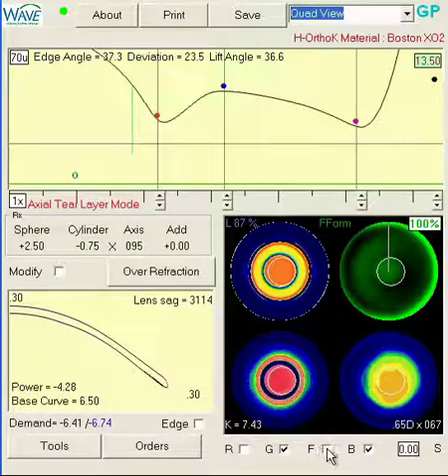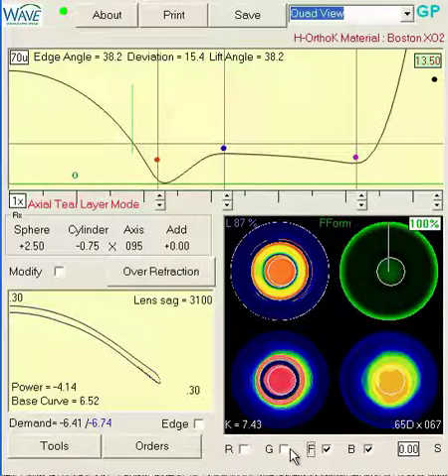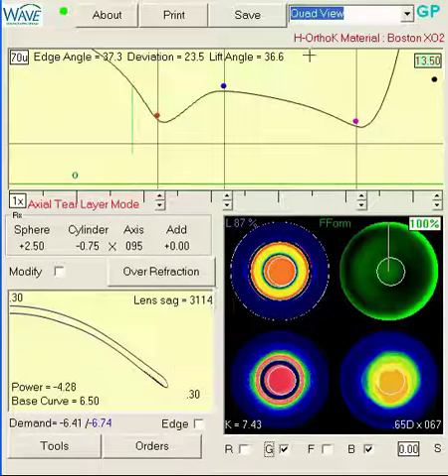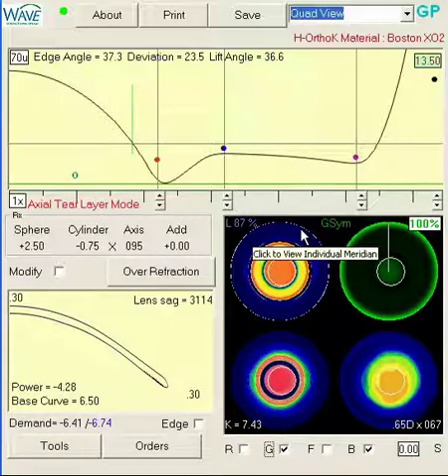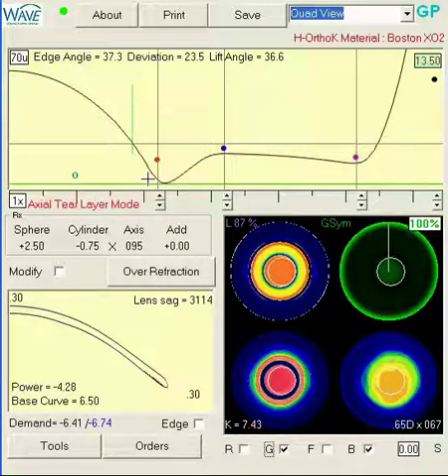Just checking the freeform box here. It looks like it works, but the recommendation is to not do that, and I don't know all the technical reasons for that. The recommendation is to go through tools and kind of design a new lens. So that said, the freeform change is maybe optional at this point. I would definitely increase the demand, and that should get the patient seeing better. The freeform change may get a little bit better alignment as well.